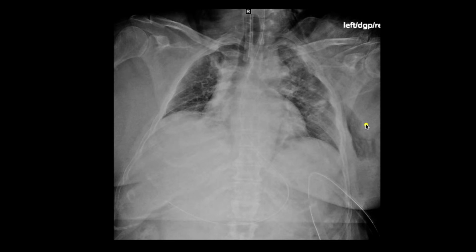And so a chest drain was inserted, and you can see a chest drain here looks a little bit low, but it's okay. Sometimes it can sort of drop back into the posterior costophrenic recess. However, this one is actually directed inferiorly, and this had gone through the diaphragm and had actually punctured the spleen, which is obviously not an ideal position for a chest tube. So in this X-ray, we've got 3 invasive devices. We've got the endotracheal tube, we've got the nasogastric tube, and we have the chest tube. 3 different invasive devices, and we're responsible again to make sure that they're all in the correct position. And 2 of them are, but 1 of them clearly is in the wrong position.